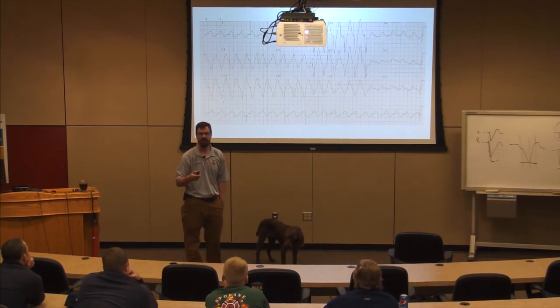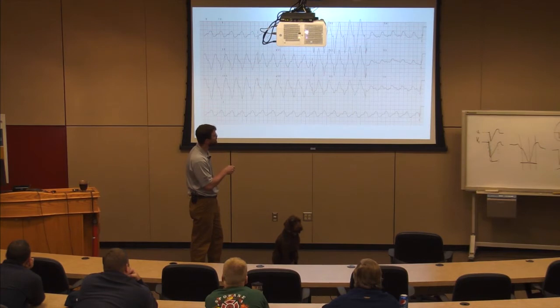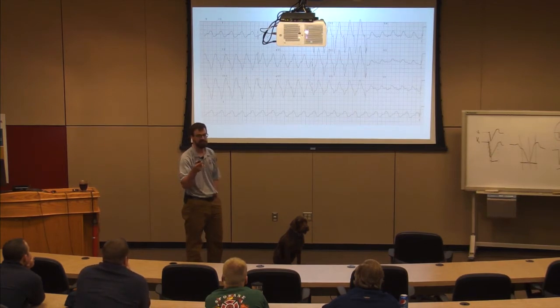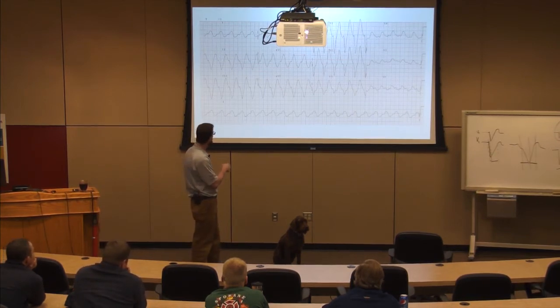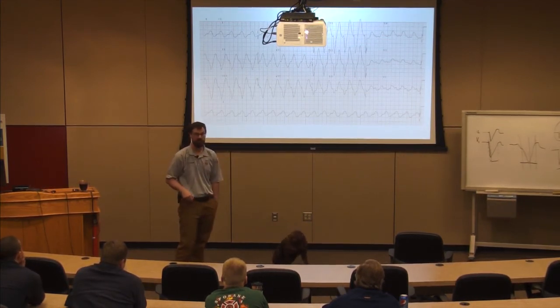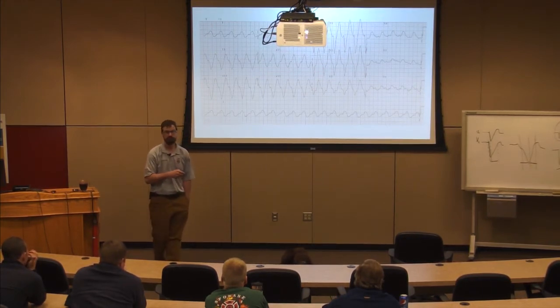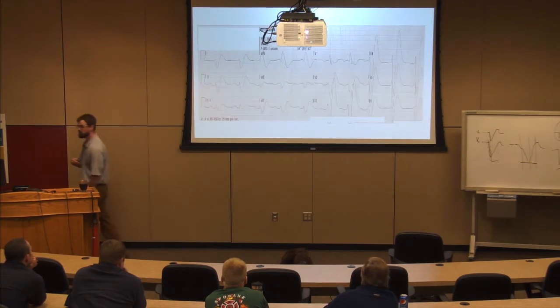Classic VTAC, if it's from the right ventricle, will mimic left bundle branch block, and you'll see a notching in the downslope in your precordial leads. So notching in the downsloping here will definitely be a hint towards VTAC, but over in here, not so much. So this doesn't really fit VTAC. It doesn't fit a left bundle. It's bizarre, and I have a prominent R wave. Make sense?